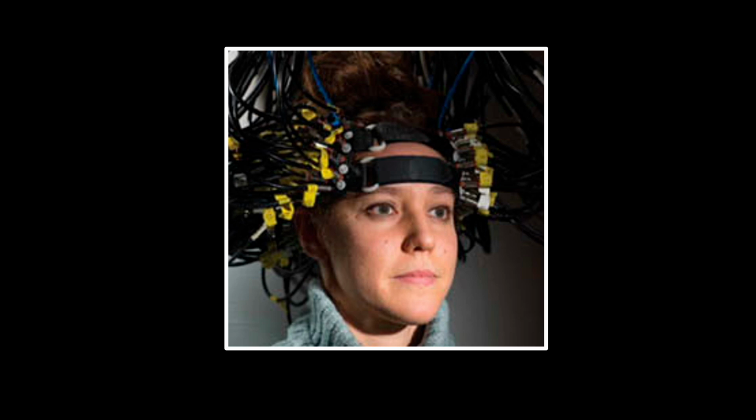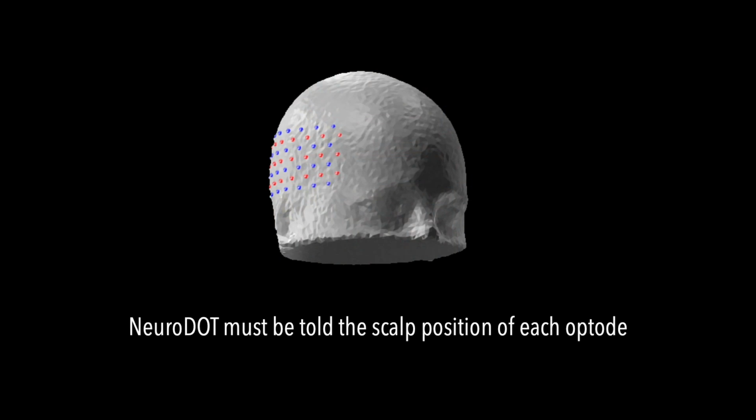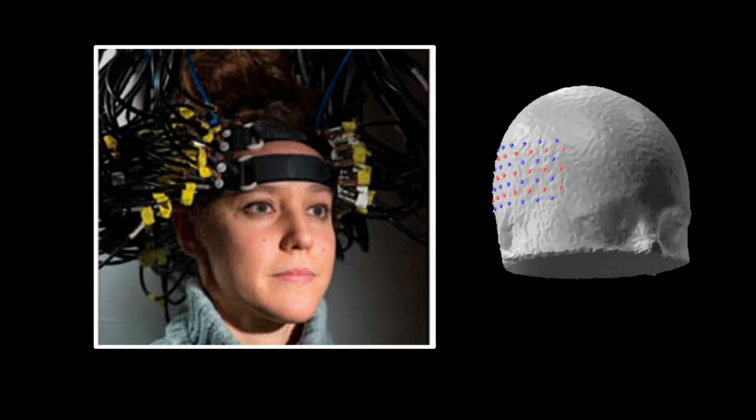We begin with the what and why of array alignment. Put simply, in order to process array data, NeuroDOT must be told the scalp position of the optodes. At first glance, this appears to be straightforward. Each optode has a known position in the array, so knowing the orientation of the array on the head should allow the scalp position to be determined. However, there are two complications.